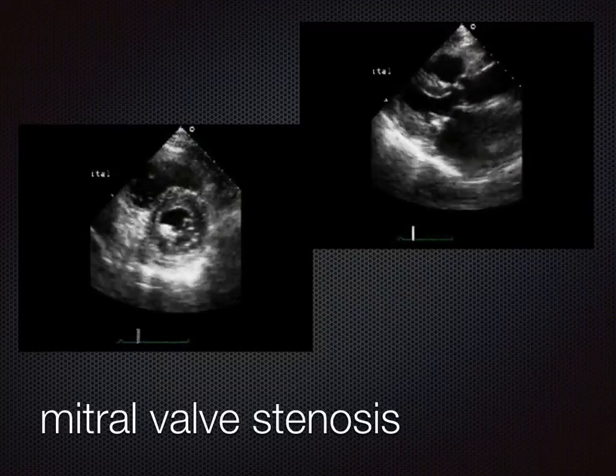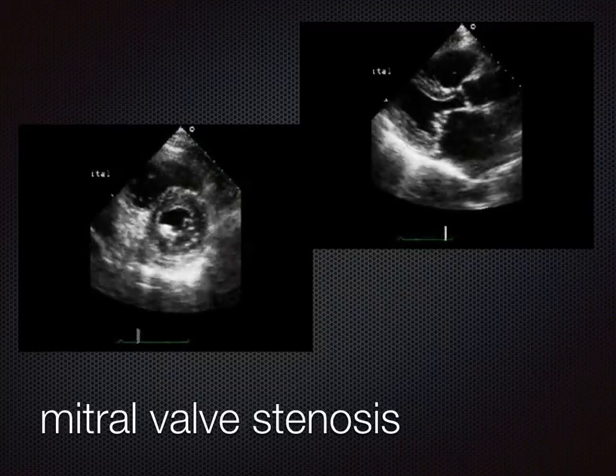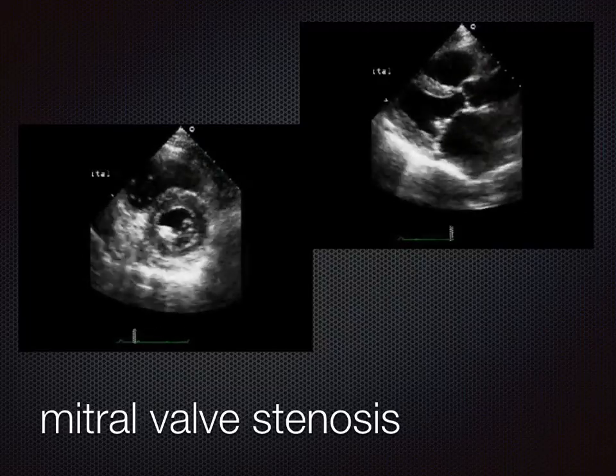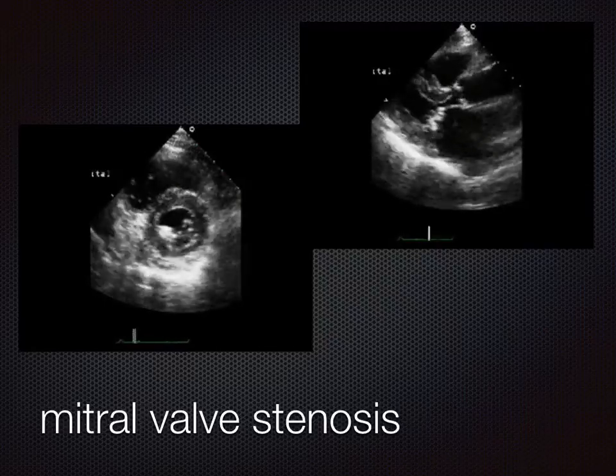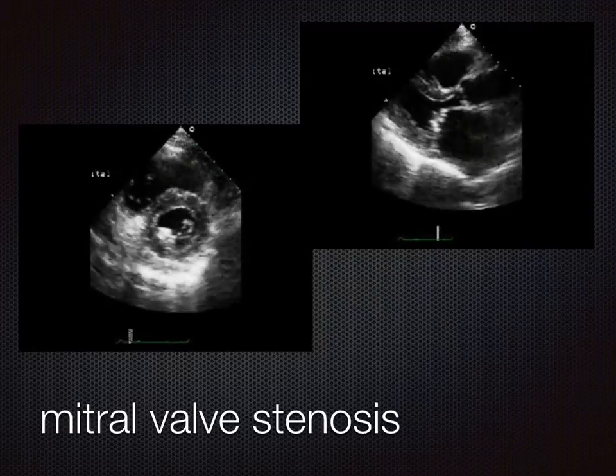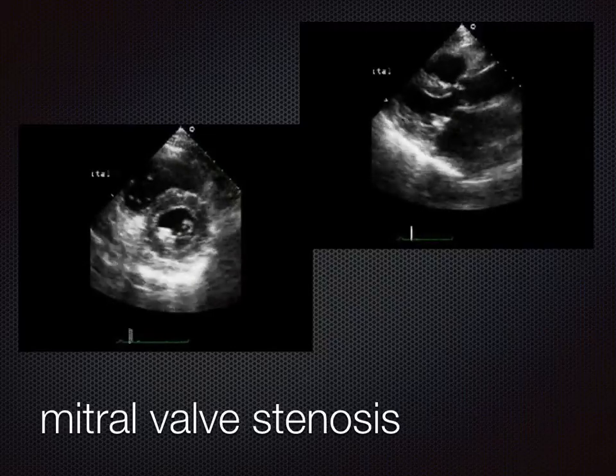And the internal diameter of the left ventricle is actually narrowed. You could say the walls of the left ventricle are thickened. So at rest, when they're not contracting, they seem to be significantly over 1 centimeter in thickness.